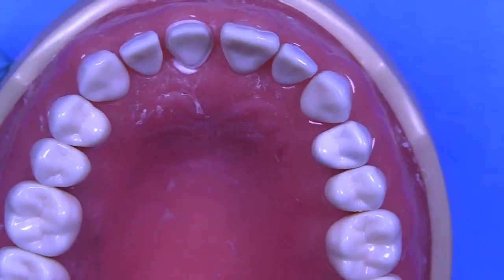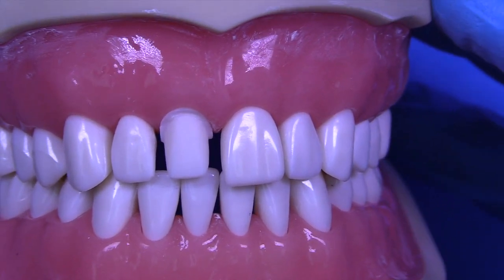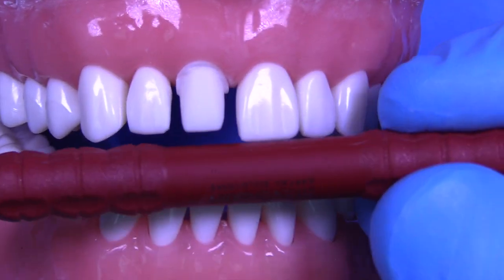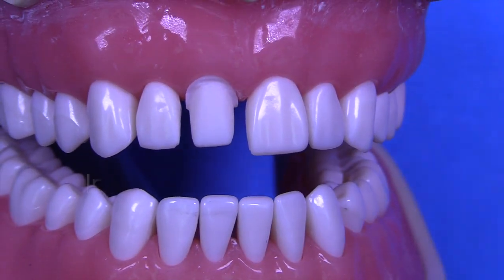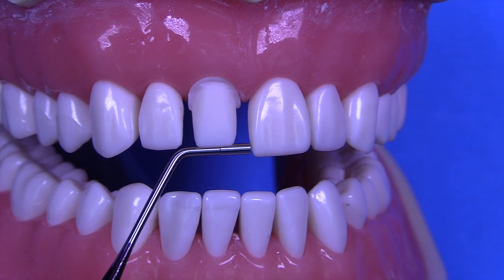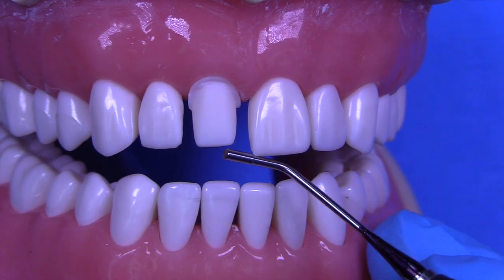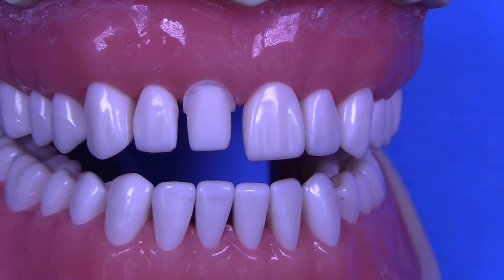So let's go ahead and take a look at these 7 views and see what we can see. Generally speaking, I think the preparation looks pretty good. We like to see that the reduction at the incisal is approximately 2 millimeters, and you can hold an RGS 4 right here and see that it's a little shy. It doesn't quite get to the 2 millimeters. You're closer to 1.5. So I would have reduced a little bit more off that incisal edge for a PFM.